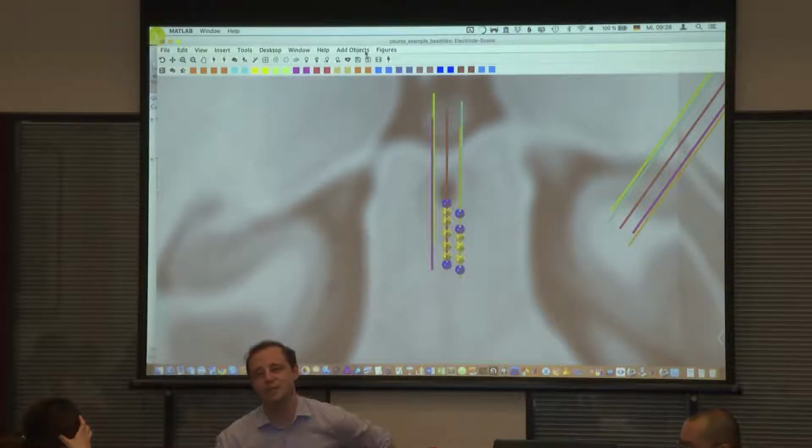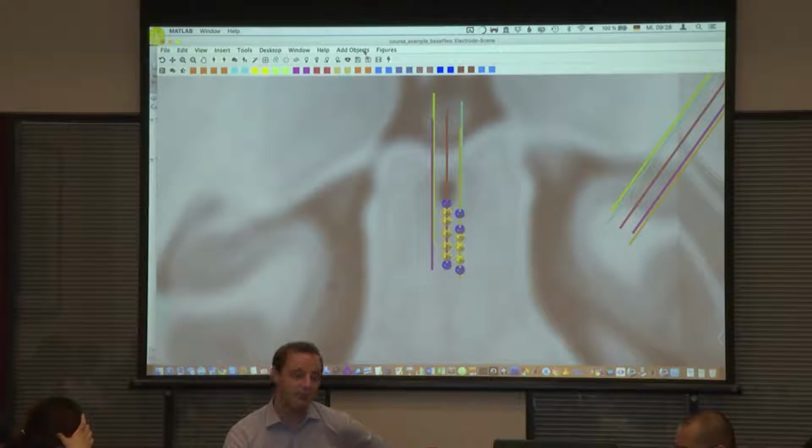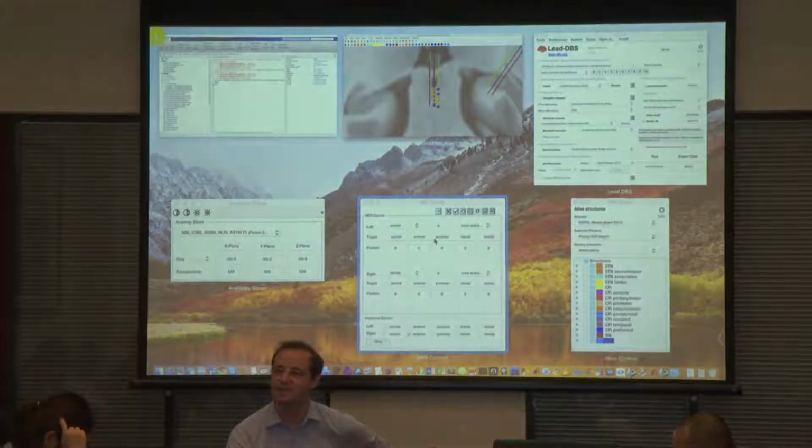You would really need to make sure that the space makes sense, that it's in MNI space in this case, or in the native space. And sometimes these files are not stored properly, depending on the software you use, but you can play around with that at least. And yeah, that's that. Any questions?